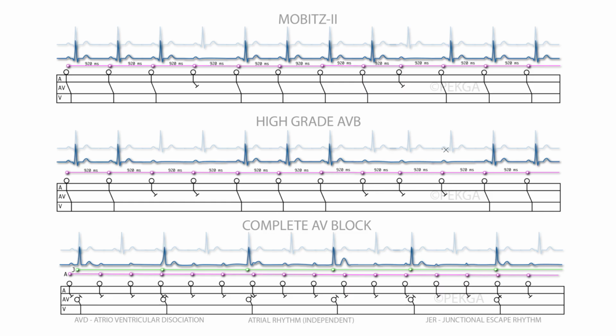And again, that's what a high-grade block would look like. Now, there are many, many different versions of this, right? You have 2 Ps, 5 Ps, 6 Ps, whatever the case is. Well, I got carried away there. 6 Ps. Now we're getting into some shady territory.